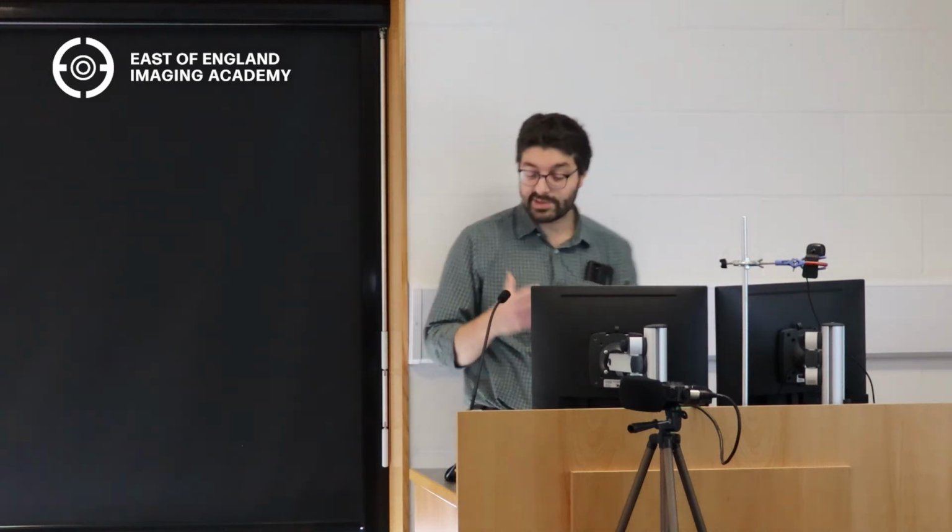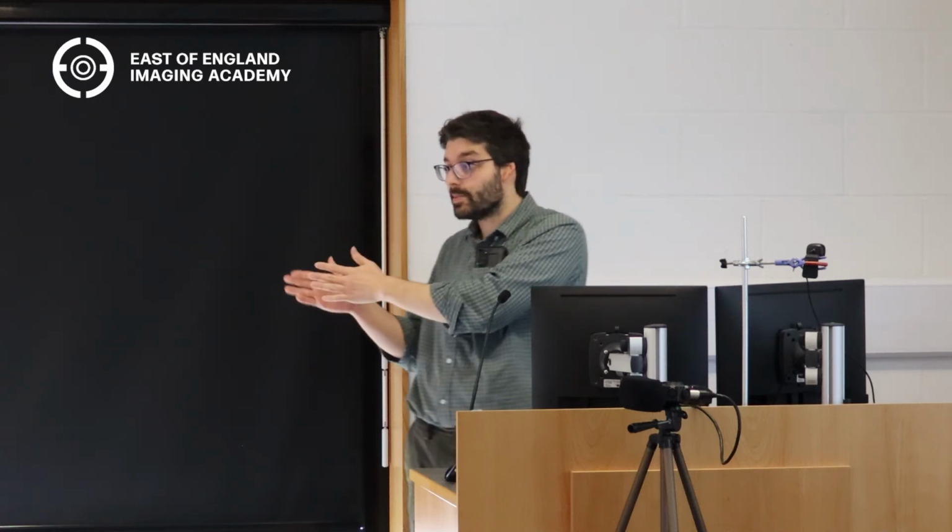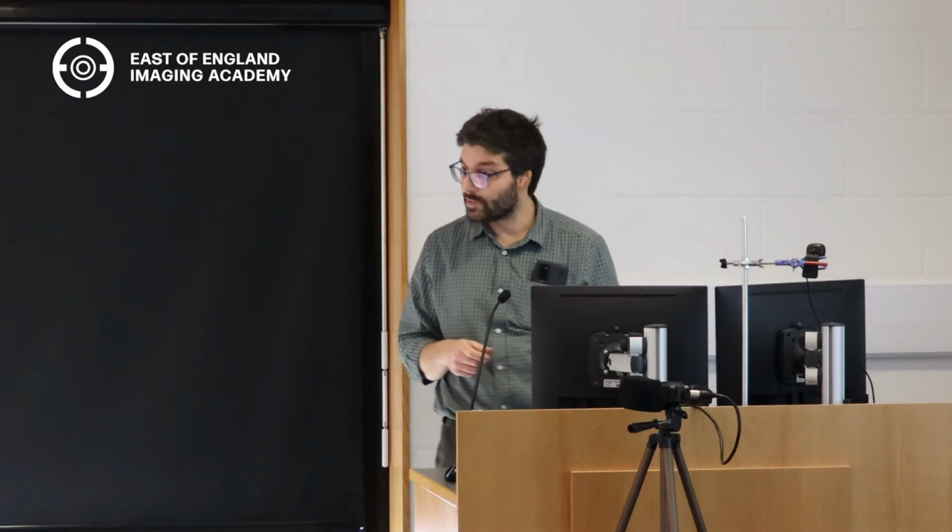So endometrioma is a good thought, okay? You're absolutely right in not just tunnel visioning into tumor, because it won't always be cancer. Sometimes it's other things, like GIST. So GIST is another thought, absolutely. So GIST and pseudopapillary tumor will probably be your number one and two.